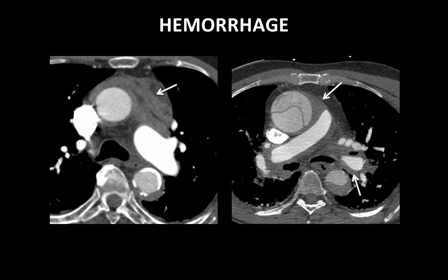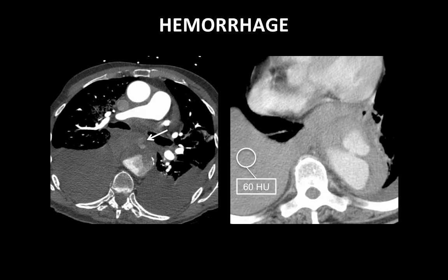It's also important to note whether or not there are any signs of hemorrhage or rupture secondary to the aortic dissection. Sometimes we can see frank rupture directly on the CT angiographic images. The patient on the left of the screen, there is active extravasation into the posterior mediastinum, and then this patient on the right is one that I showed you before, penetrating atherosclerotic ulcer that had ruptured into the right pleural space, giving us a hemothorax.